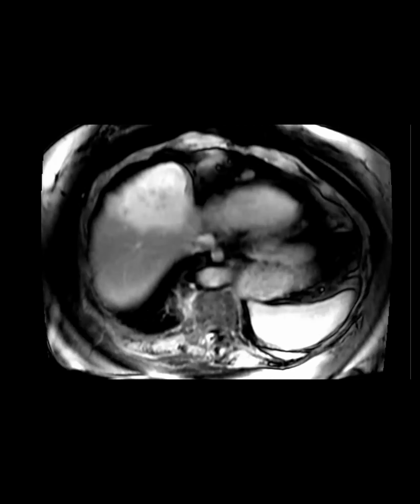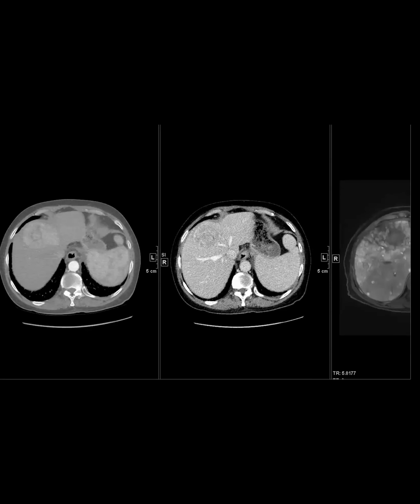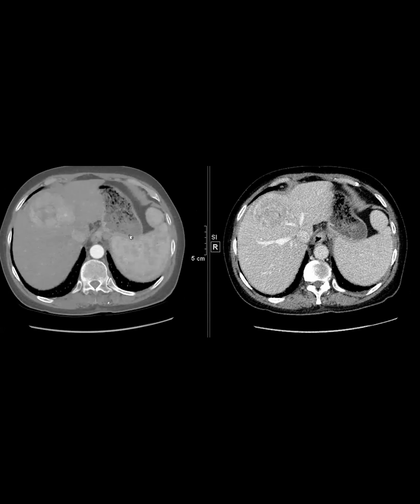Comment? Yeah, no, I feel like hemangioma being mistaken for a malignancy and vice versa is a common conundrum. So the more we can familiarize ourselves with both hemangiomas, all the typical and atypical, the more helpful. Steve says, I put a lot of weight on the ultra fast T2 here, not typical early on. So I think the T2 usually is very helpful.